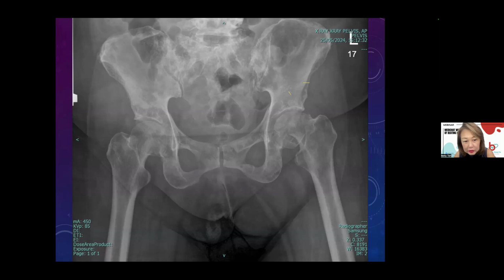Alert 4, yes. Yes, Farisa, you got it right. Left neck of femur fracture. Okay, so here, you see? So again, in this case, Shenton line, very important, draw it. Then compare both sides. See, you can't draw the Shenton line on the left side. It's fractured and then impacted. So we cannot miss a neck of femur fracture. Is this because of pathological fracture? Yes, due to mets.